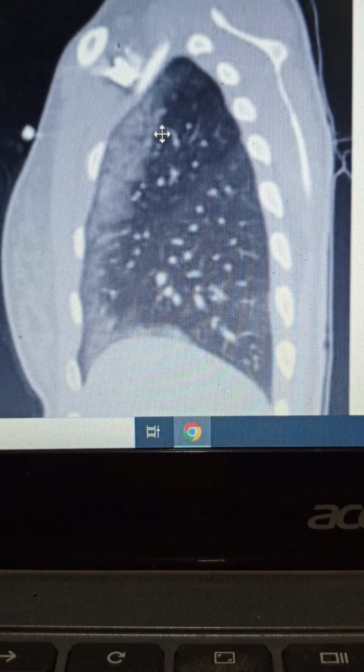So can you guess the diagnosis in that case? One of the findings of that disease, the abnormality, is also in this picture. The picture you are seeing in this CT is classic for that finding. So I gave you a brief history. Can you guess the diagnosis? I give you 5 seconds.